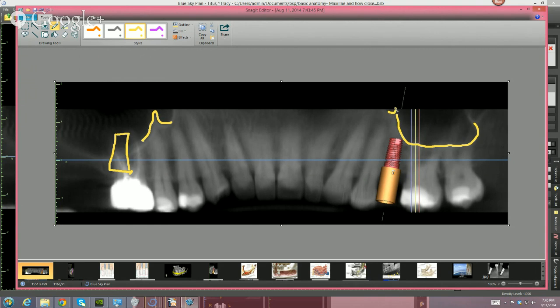What you don't see probably is another little septum over here. Again, the importance of a septum is a different issue. That's for surgical anatomy and not for planning. But if you wanted to plan a case that would be shy of the sinus, that would be a good cliff to stay away from.